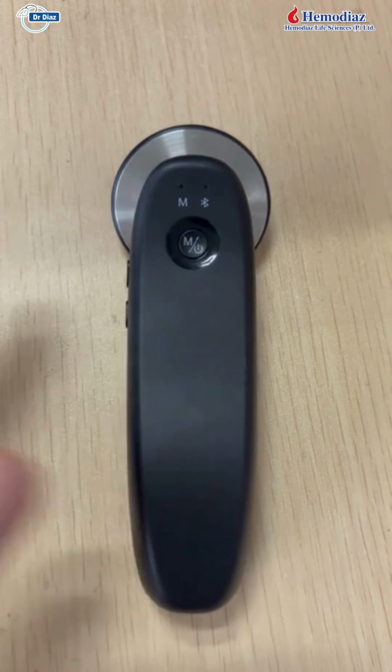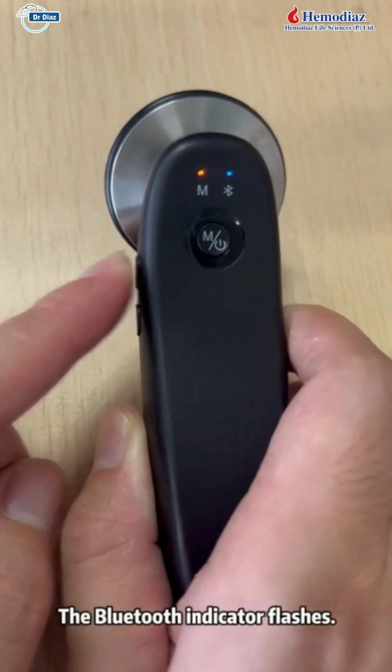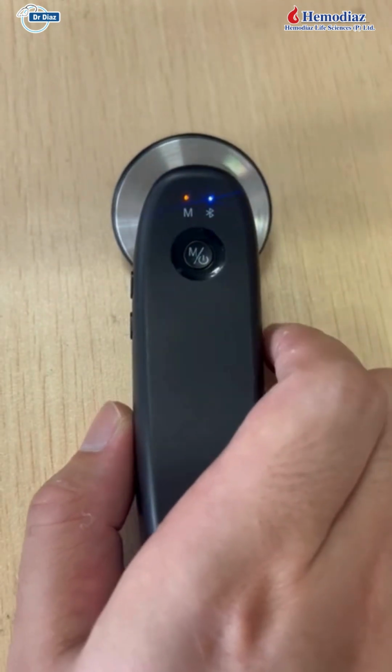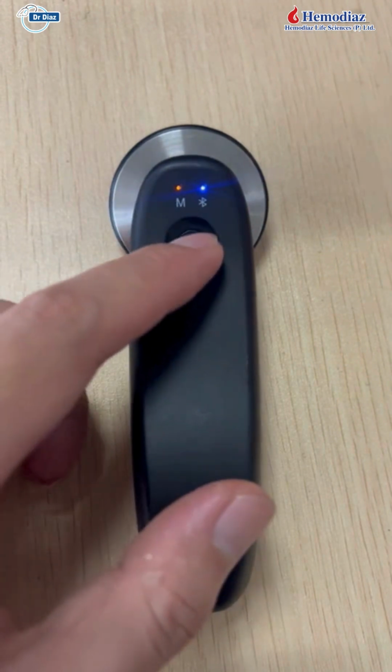How to turn on Bluetooth? When the device is turned on, long press the volume up button for 3 seconds to turn on. The Bluetooth indicator flashes. After the Bluetooth connection device is connected, the blue indicator light is always on.